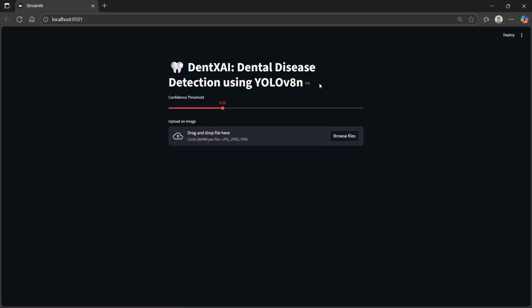Hey guys, in this video I'm going to show you how you can train your own YOLOv8 model on your custom dataset to detect any kind of objects. Currently I'm in my final year of engineering and I've been working on a project, dental disease detection using YOLOv8. Basically I'm trying to detect any kind of diseases. Right now I've worked on detecting cavities in intraoral images as well as in x-rays, and further I'm going to move on to detect dental lesions like periapical and periodontal lesions.